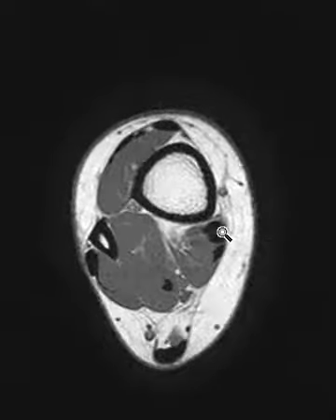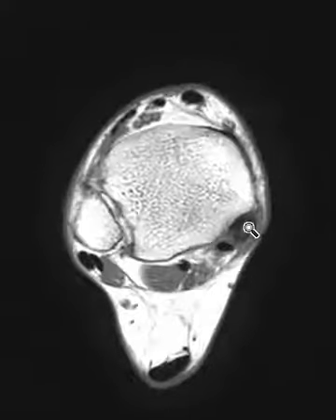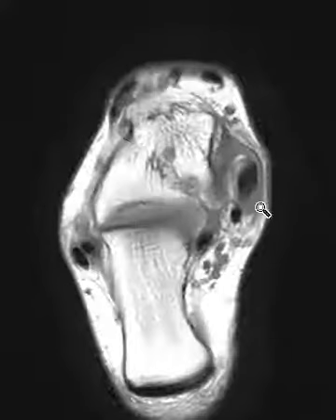This is the axial T2 sequence, and on this we can see our highest cut here. Looks like it's a little bit plump on our highest cut. As we go down, it's enlarged, foggy and ill-defined, with a little longitudinal intrasubstance signal there.